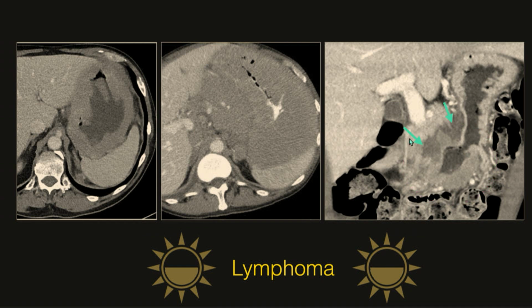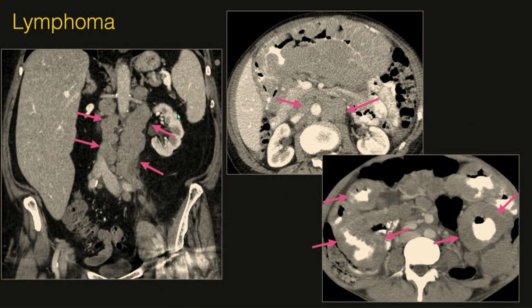So the concept of cancer and ulceration, or cancer and inflammation in the stomach, is something to be aware of. So don't let the most alarming feature guide you. So there's that soft tissue thickening of the wall, and then there's that low attenuation. So there's ulceration here, and then there's that soft tissue component. So this is lymphomatous tissue, and then there's some ulceration as well. And again, the other manifestations of lymphoma, you'll look for nodal disease, and you might even see bowel thickening elsewhere.